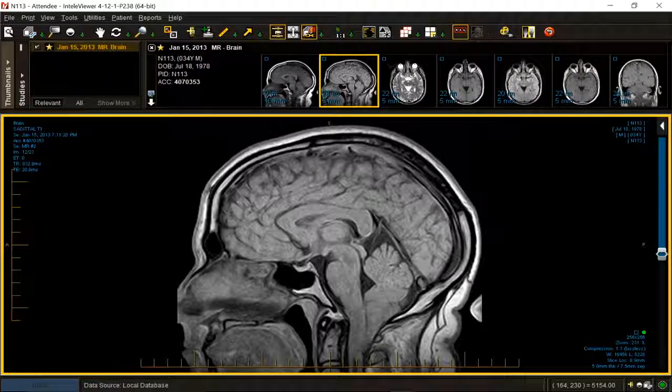The tonsils are low. They're not pointed or they're a little pointed. There is no syrinx. There are no bone anomalies. Therefore, you should make the diagnosis of tonsillar ectopia.